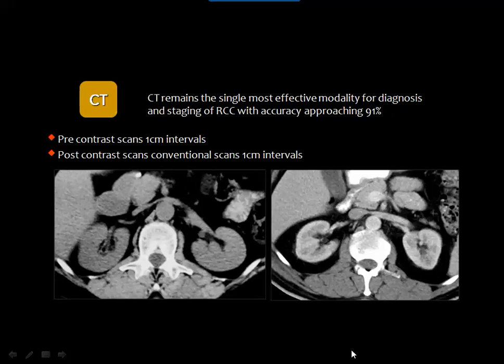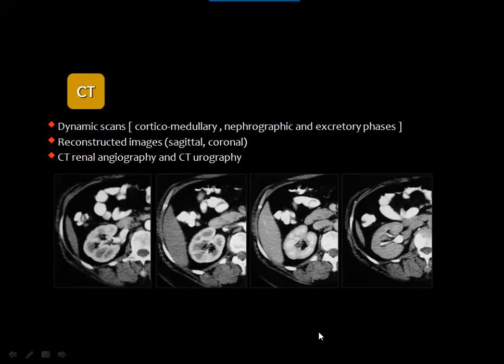The CT examination performed after injection of contrast media should be preceded by pre-contrast scans for the renal areas. Then you have a CT of the kidney before injecting contrast media. Then you have CT of the kidney, the ureter, and the urinary bladder after injection of contrast media. After the availability of multi-detector CT, we thought to perform a triphasic study for the kidney.